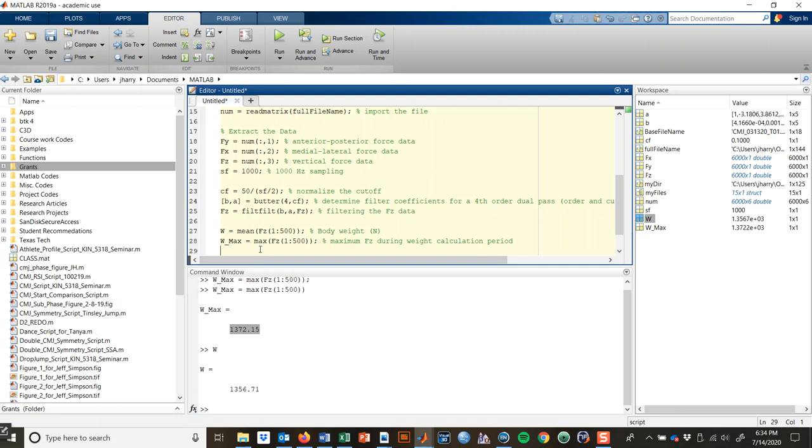Personally, I've used other methods in the past, but it does seem like this may be the more ideal way to go about it, using 5 standard deviations and a plus or minus threshold. So we're going to stick with that here. I'm going to create a variable called SD5.